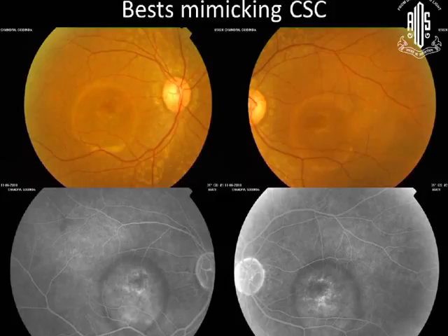Yet another patient presenting with what appears like bilateral central serous retinopathy. Is it bilateral central serous retinopathy? Central serous retinopathy in children we hardly see, isn't it? So what do we look for? The clue is here. See this yellow stuff? So what is it? Dr. Shukla again showed, yes, Best disease.